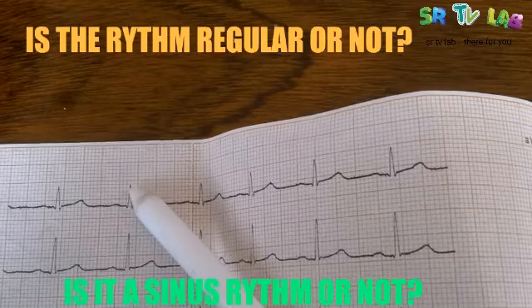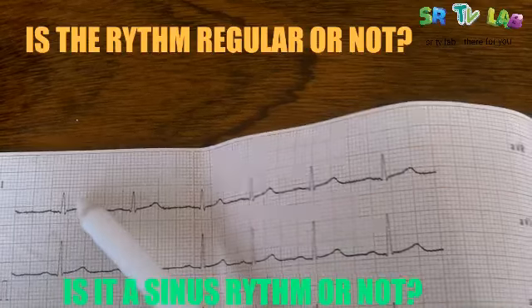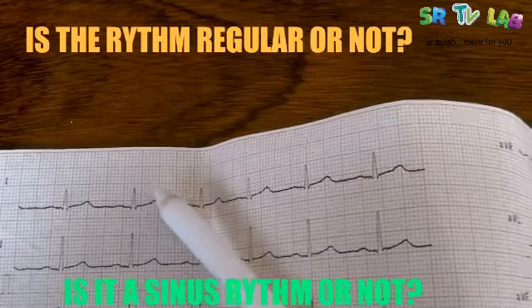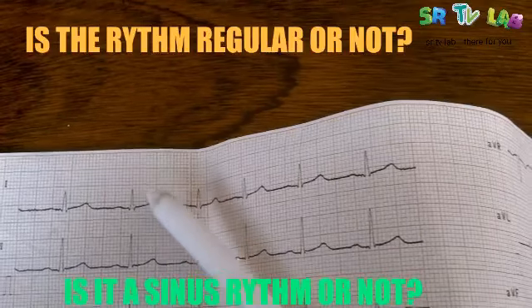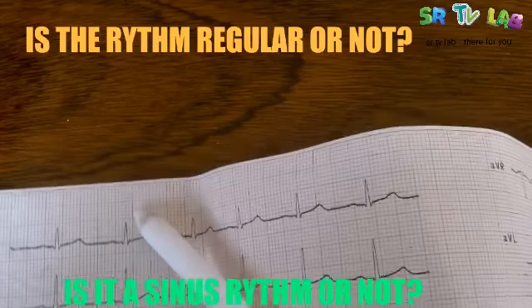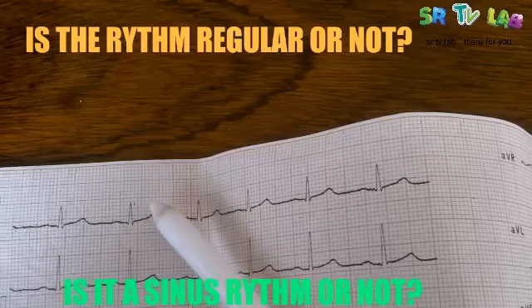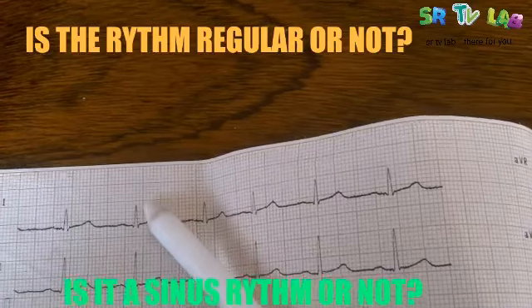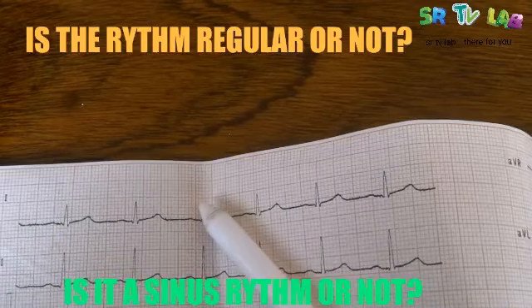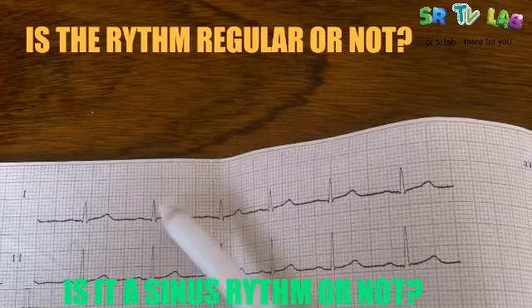Here also 2.5, which means it's like 3 big squares and 4 small squares. When I say big squares, these are the squares that are big. And within the big squares, there are other small squares. 1, 2, 3. Then here we found 2 small squares and 2 small squares here.